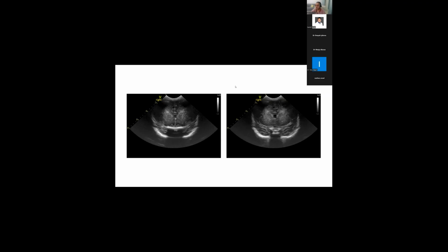And what stands out quite well to me is, for a baby who's 24 weeks, this is pretty decent at this particular point in terms of the growth of the brain, in that it fills the screen. Anything else about the critique? So we talked about dropout. Any other critique?